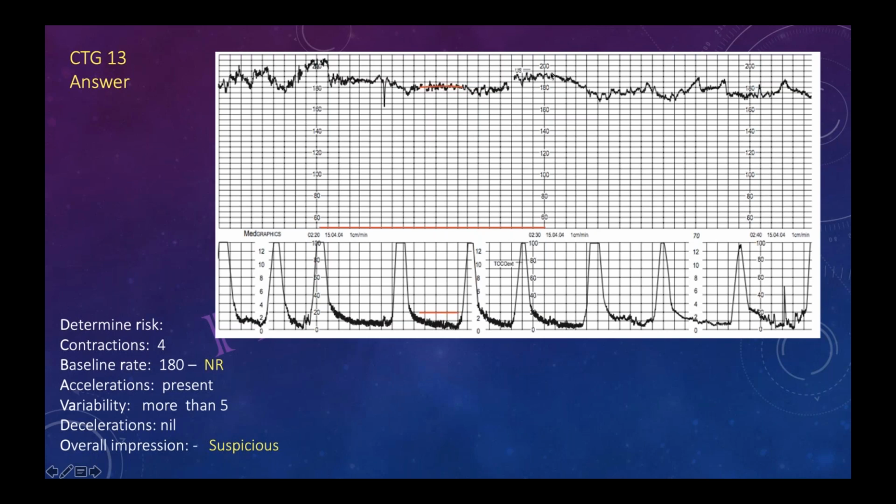Now you are taking this, but this is corresponding to contraction. So we will not take this in the baseline. This contraction, just after the acceleration, there is a gap between the contractions, which is going to more than 180. It is going almost to 190. Here, the first one, the one after that acceleration. Yes, that part. This is more, yeah, you are right. This is more than 180.